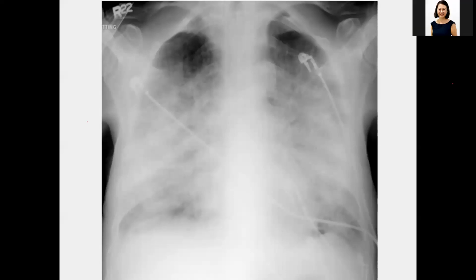Is it bat wings? Yes. So Dr. Betty can answer most of the X-rays. This bat wing, this bilateral consolidation, is already obscuring the heart, maybe some cardiomegaly, and also blunting of the costophrenic angle with some pleural effusion, pulmonary edema. All right.